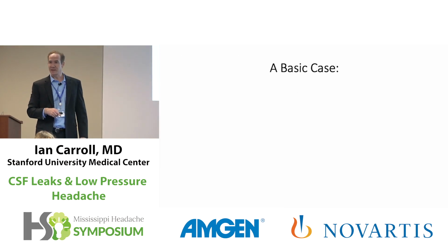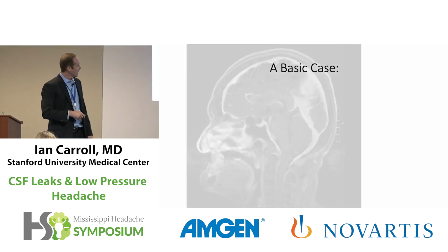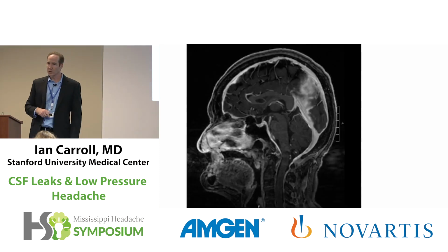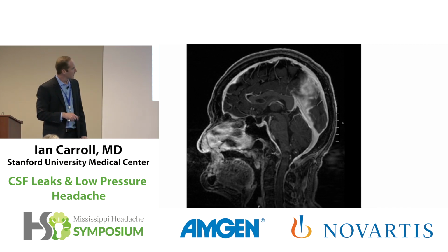So let me start with a basic case. This is the thing that gets diagnosed as a CSF leak all over the country, very straightforward. This is a 70-year-old woman. She fell down, woke up, and had a postural headache when she got up after falling down. They imaged her to try and figure out why she was hurting, and you can see immediately apparent that the dura, all the way around, is enhancing. This is called pachymeningeal enhancement.